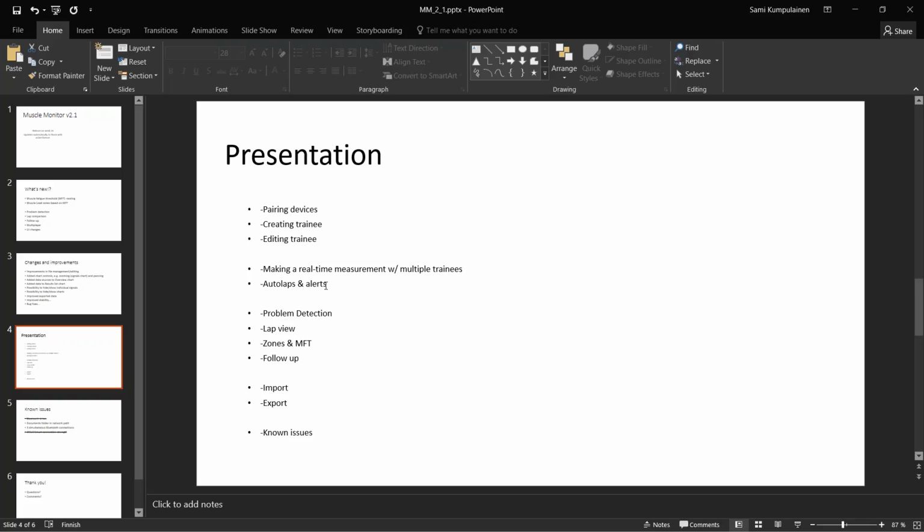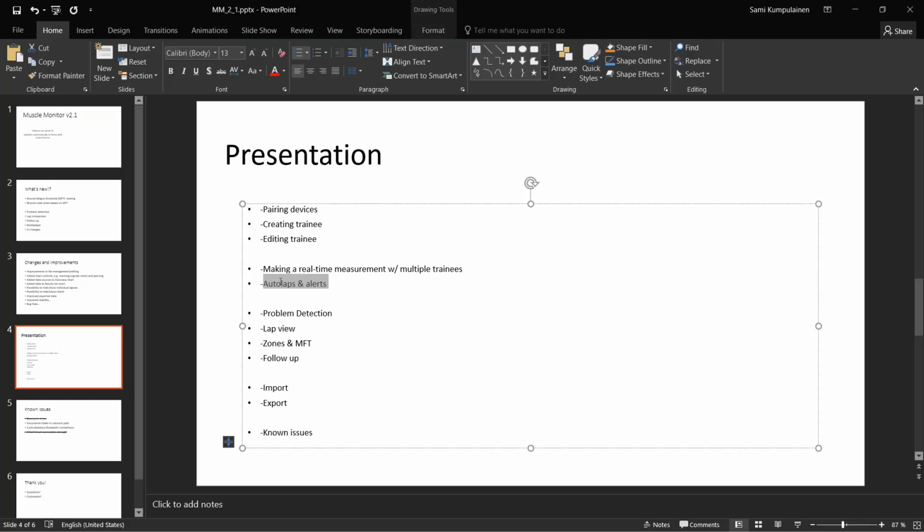These are already familiar from the previous version, so we'll go through these quickly. Okay, then we'll cover at least the main feature changes. I'll try to show you some data and good examples with these. Also, quick look at importing or adding other data to the EMG. Known issues, and lastly, if you have questions, I'll try to answer, of course.